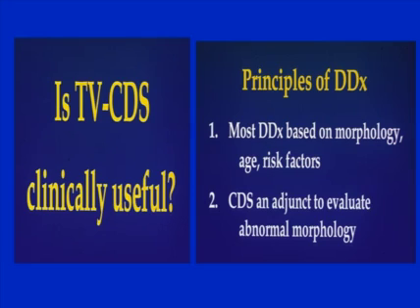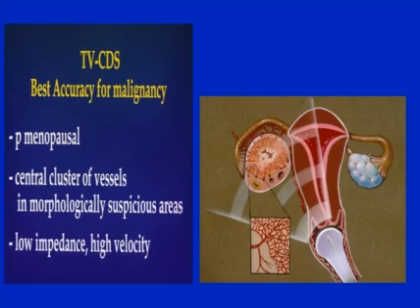So is color Doppler clinically useful? The answer, of course, I think it is very useful, and it's useful as an adjunct to abnormal morphology. And we really feel that what we're looking for are clusters of vessels in morphologically suspicious areas.